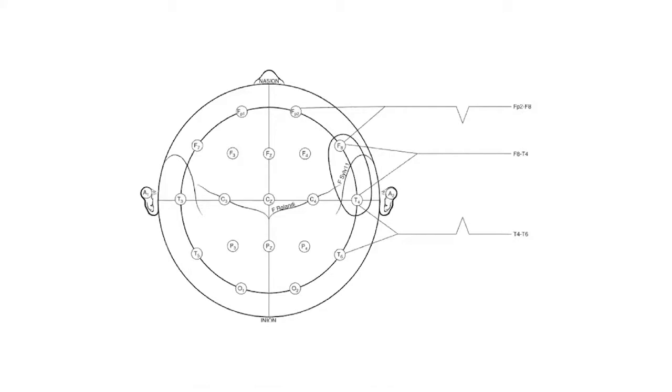And you can also see that the circle or the oval that includes the F8 and T4 electrodes produces an output that's flat. Well, that oval is intended to indicate that the electrical field of those 2 electrodes is the same. And so you subtract anything from something of similar value or equal value, really, you get 0 in simple math. And so the output here is flat, but that doesn't mean there's no signal there.